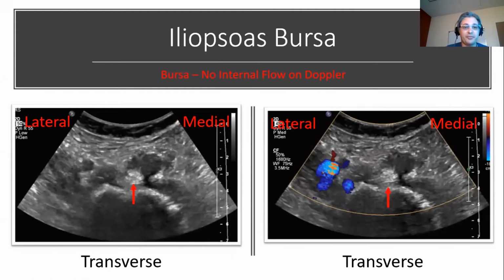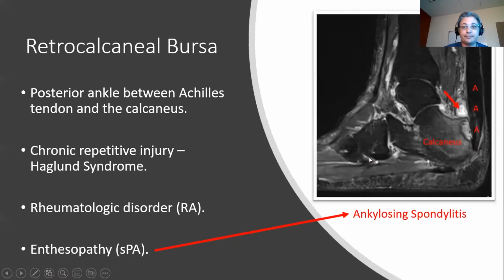Another nice example I had from just the other day, a smaller example of iliopsoas bursitis, but still the anatomy is well demonstrated. The echogenic round structure is the iliopsoas tendon. This small cystic appearing mass, anterior and medial to the echogenic iliopsoas tendon, is a small iliopsoas bursa that on color Doppler interrogation has no internal flow, confirming the cystic nature of the mass.